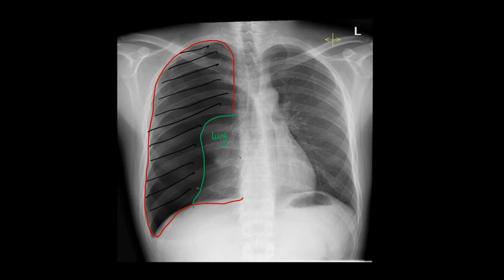You can also see that the diaphragm has been pushed down. It's almost at the same level, or even maybe slightly lower than the left hemidiaphragm. It's the other way around in a normal subject. So the diaphragm has been pushed down. You can hardly make out the right heart border. You can also see tracheal deviation all the way to the left. So this is a medical emergency.